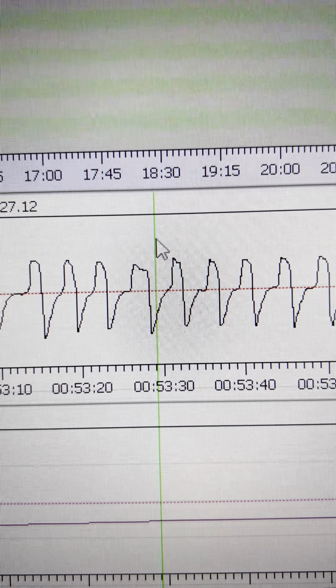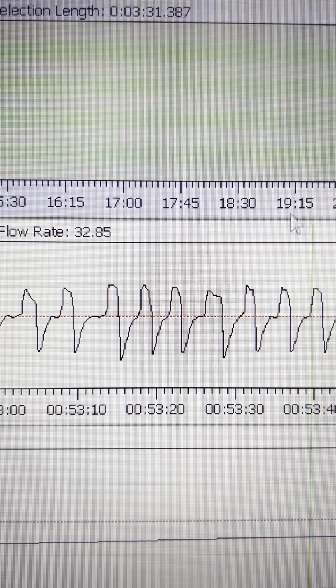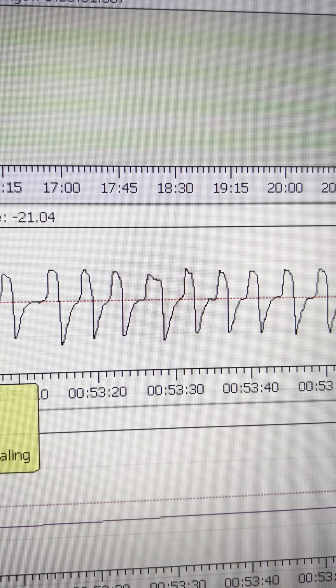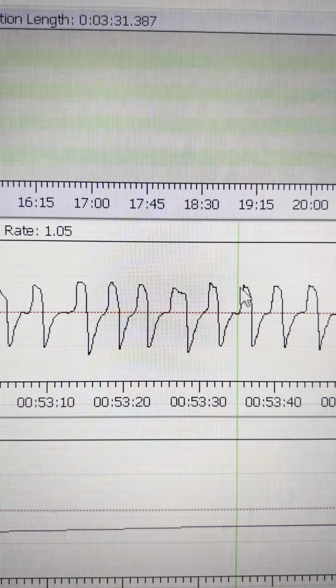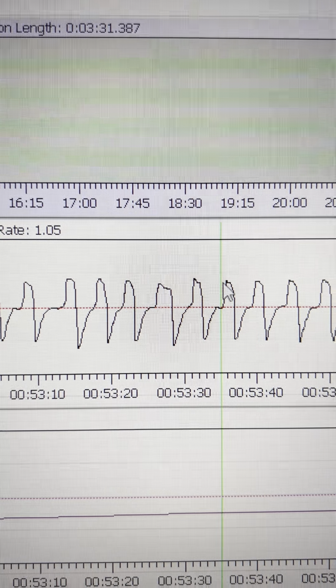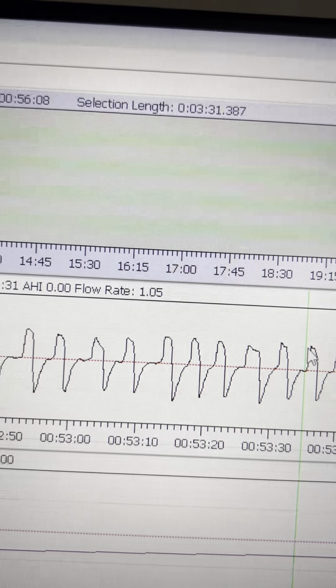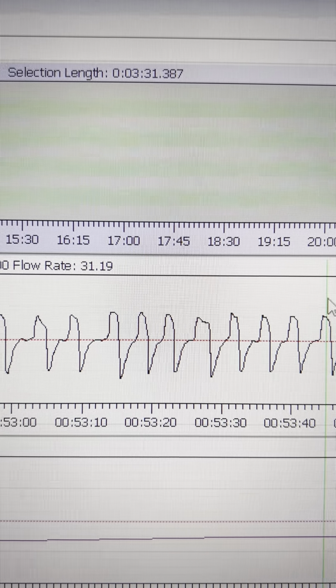And people in the CPAP world would say, oh yeah, you have to up your EPAP more. But some people will feel worse on EPAP and some people will feel worse on PS. I would just see how you feel the next day and up PS only by 0.5 every day. And make sure that if you're getting centrals, do not go up more. That's just gonna make you feel a lot worse.